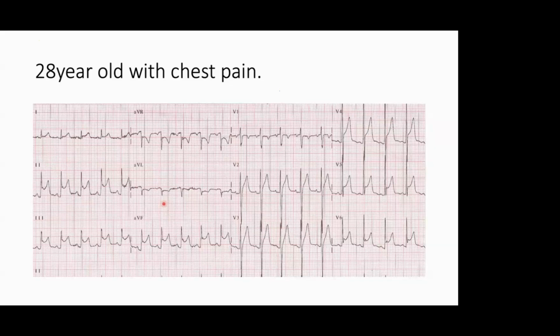There is no reciprocal ischemia pattern of T wave or QRS or Q wave. Nothing, no Q wave also is not there. And you are seeing some PR depression also. So this is a pericarditis ECG.